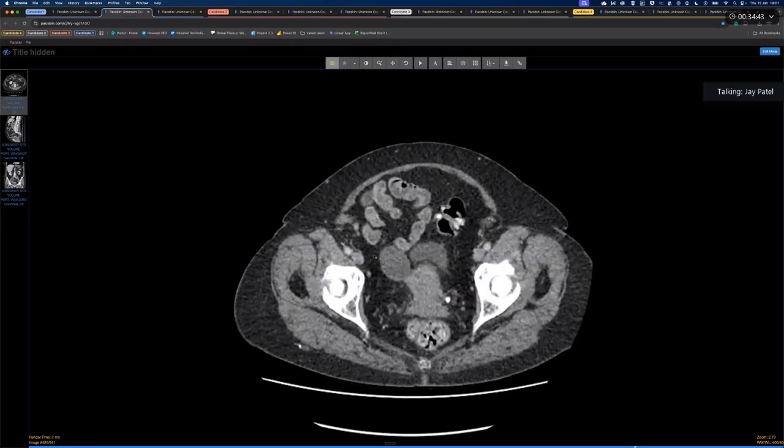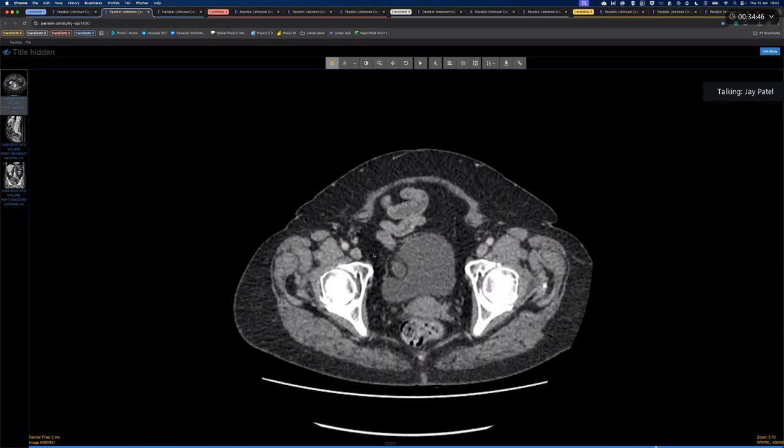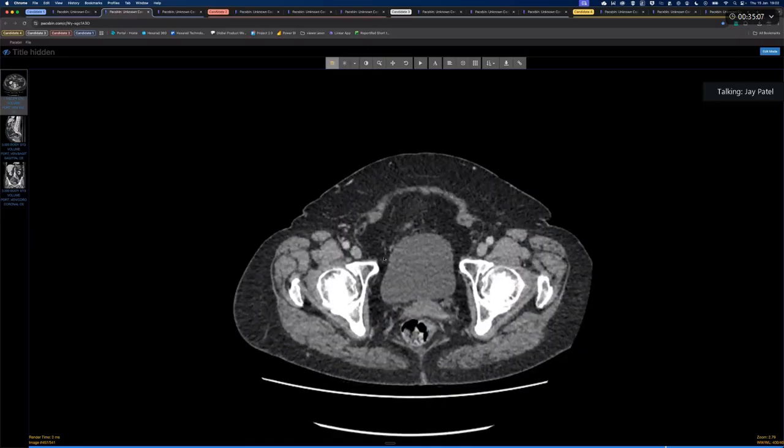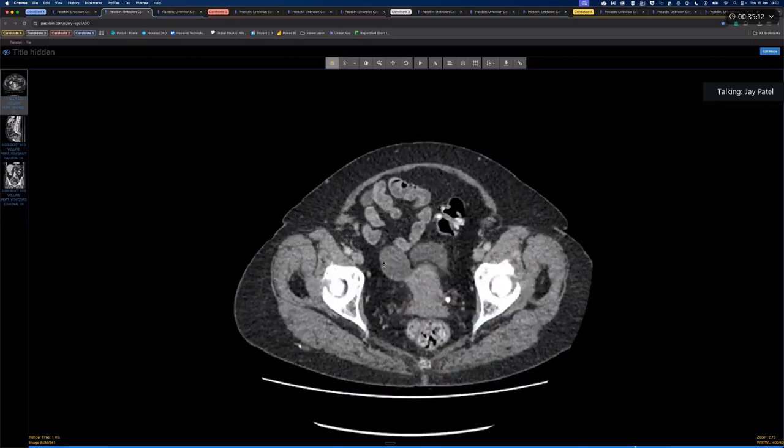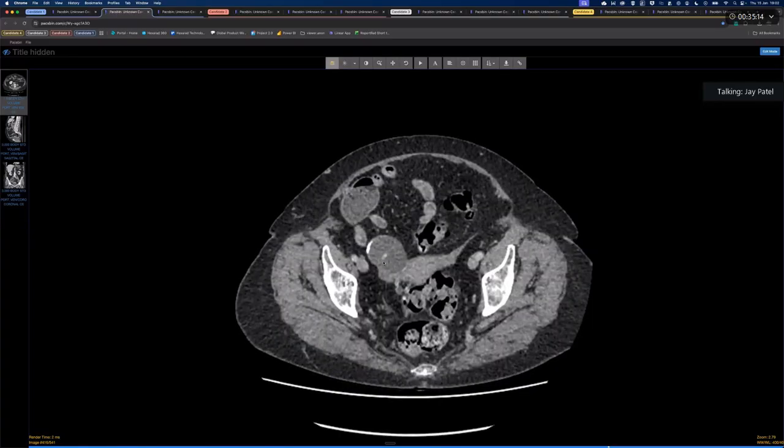Where they do disseminate, do you know the type of ascites that this might predispose to? Yes, they give the pseudomyxoma peritonei. Good. What might that look like on imaging? Indentation to the liver and spleen surfaces. Yeah, great. So you end up with this ascites that's loculated, much like you can imagine this. This is loculated inside. You can kind of see this internal complexity, right? The same thing happens elsewhere, and those loculations result in local bits of mass effect on structures.